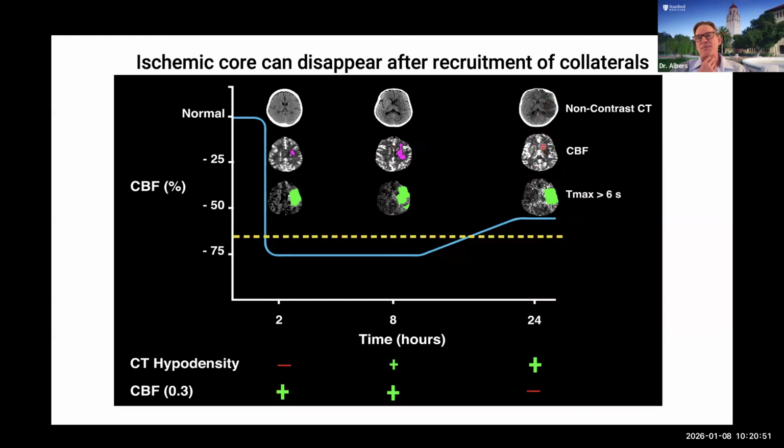The reason for that is because if you have very low Hounsfield units, if you're very dark, then the CBF pink area will be suppressed. And the reason for that is you don't want to see old infarcts turning up as magenta, because if this patient had old infarcts in the right hemisphere, you don't want to get confused by that. So the magenta means it's a new area of low CBF that is not matched by very low Hounsfield units.